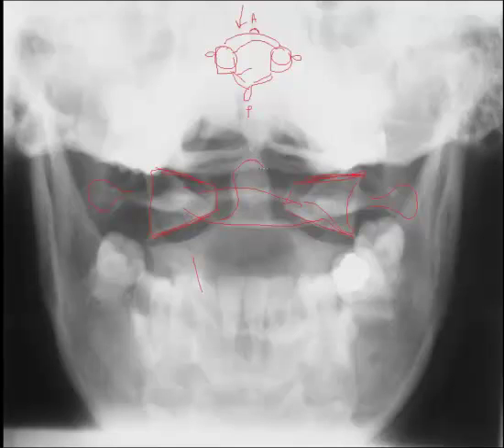Now moving on to C2, here is the odontoid process, often referred to as the dens for short. This attaches to the C2 body. The dens has a tip and it has a base and attaches to the C2 body. Now I'm outlining the rest of the C2 body. You'll notice that again the articular surfaces of C2 superiorly will articulate with the lateral masses of C1.